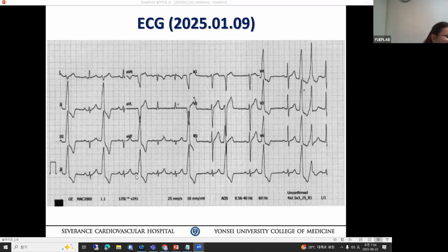P wave. That's correct. But that P wave did not conduct, right? Because the QRS did not change. Sometimes you can have a partial fusion or a capture beat phenomenon. But here the PVC came too early, before the conduction happened, so the QRS didn't change. What does that mean to you? Do you think the patient with a PVC has ventricular-atrial conduction, retroconduction, or not?